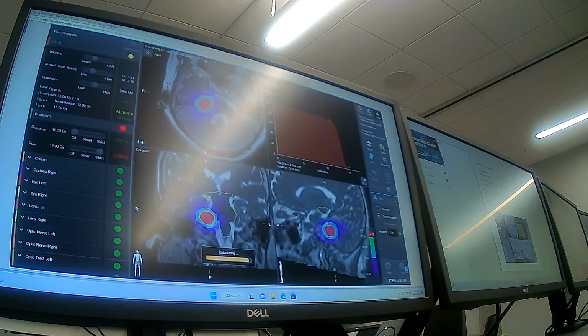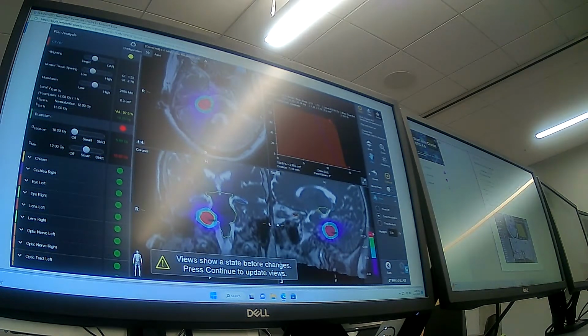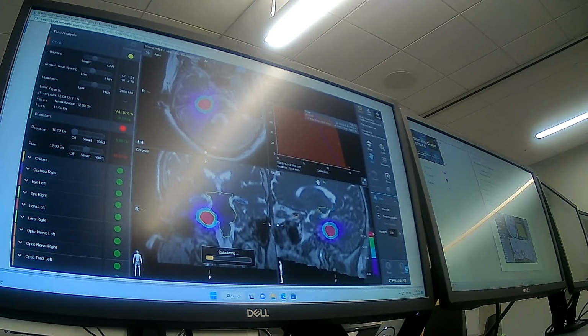Yeah, I mean, it's just trying to get you to jump around the software to see different features. So like here, click on this, and then click on set. It just shows you a different viewpoint, different ways to look at it. Yeah, it's very green, so it's very good. Oh, it's easy to mess up. Yeah, it's very red. I suspect most of the variations are just solely the contour. Probably. What margin did you use?